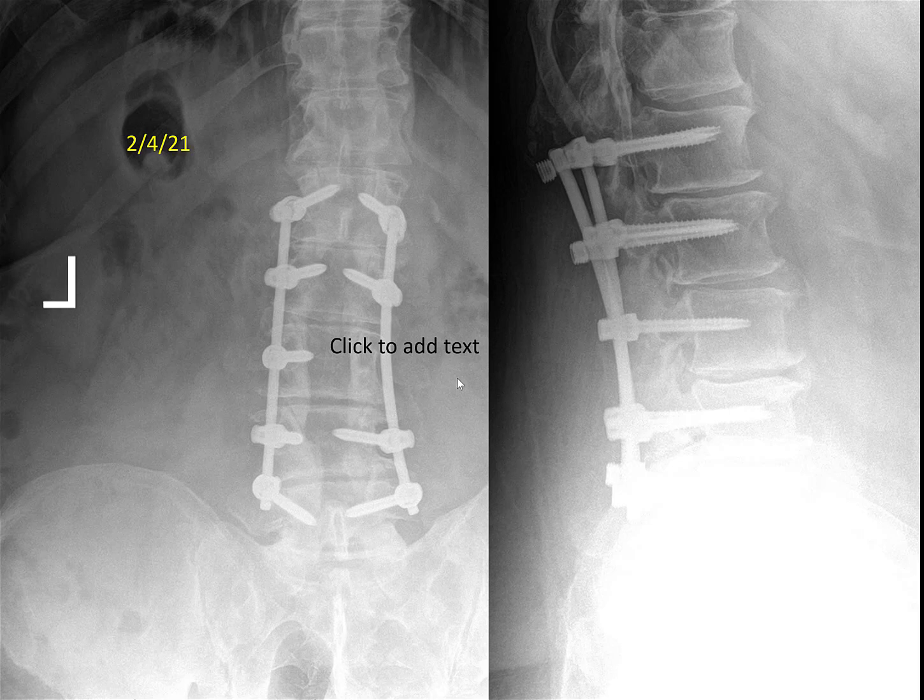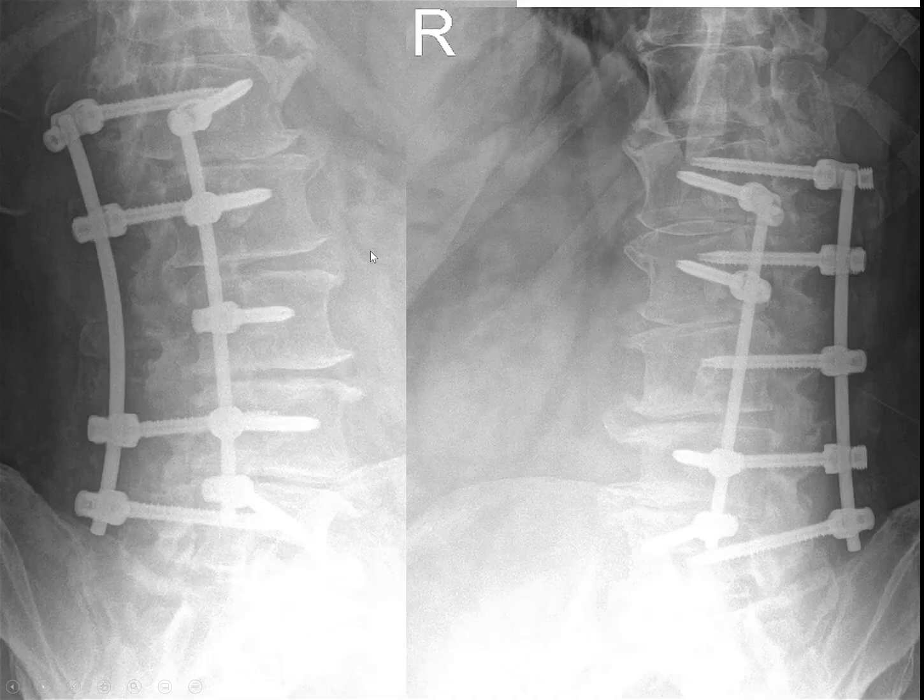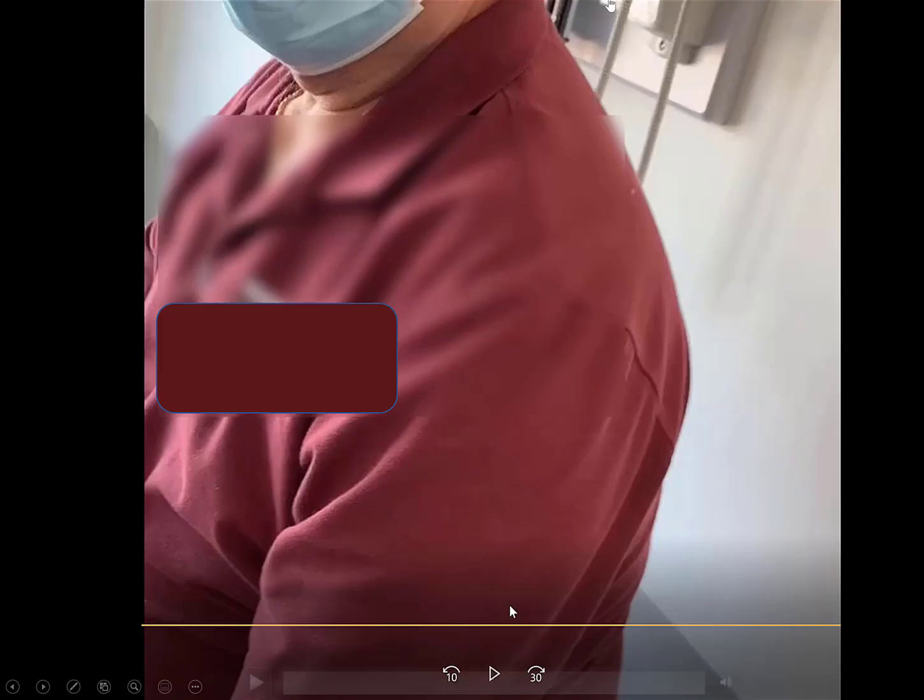and I said to the secretaries before I see him, make sure you get X-rays. So before I even came in the room, look at the lateral view. The cap came off. But these look okay, right? And the front view is kind of normal. Is he fused by now? No. And it came off because he has motion. And you can see, I also got obliques because you can usually see more details on obliques, although the obliques didn't help us too much. So here he is. So just listen carefully.